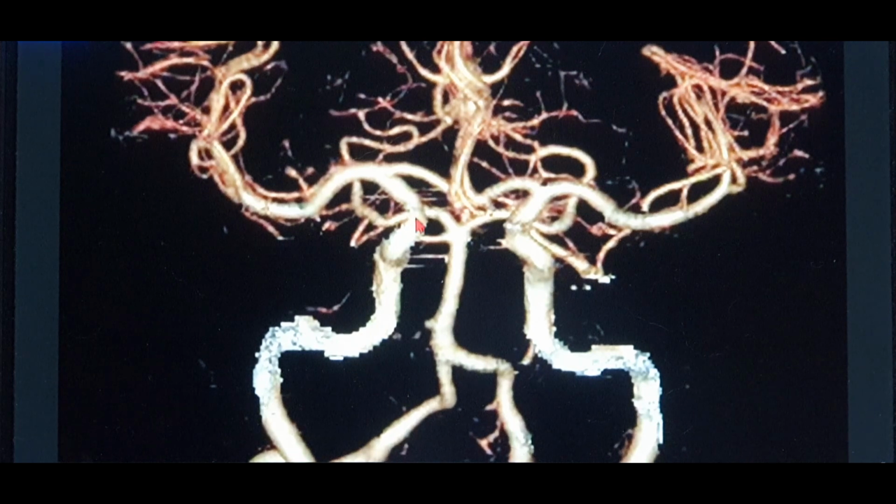That's the ophthalmic segment. You can see a faint branch, so two branches which you can see are the superior hypophyseal artery and the ophthalmic artery arising from that segment. And you can see this is a vertebral artery, the branch of the subclavian artery, arising to form the basilar artery. Then this is the superior cerebellar artery, and this is the posterior cerebral, then the posterior communicating, which will form the circle of Willis.